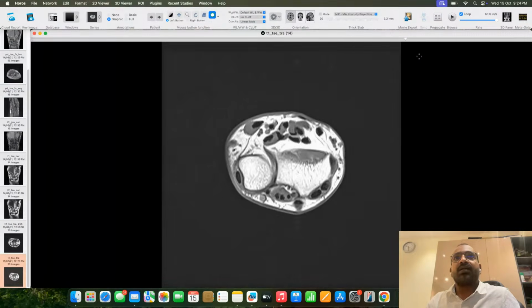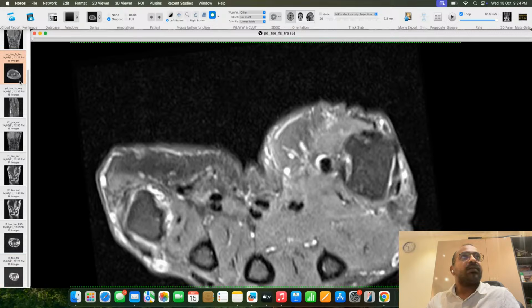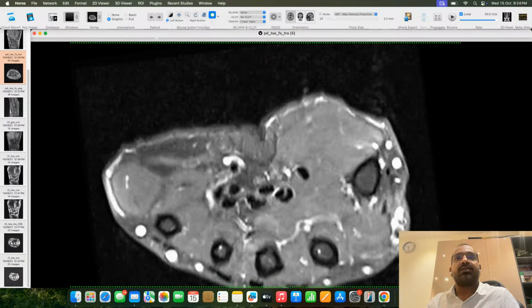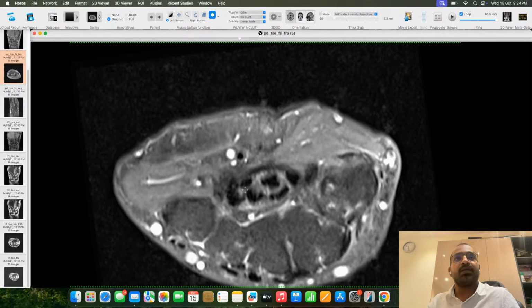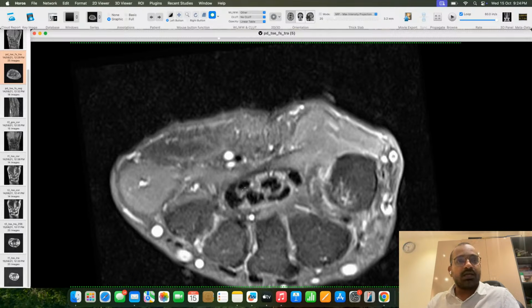All the measurements are correct. The patient is also having carpal tunnel syndrome clinically, and the NCS or nerve conduction study also showed it is carpal tunnel syndrome. Is there any abnormality I'm missing?